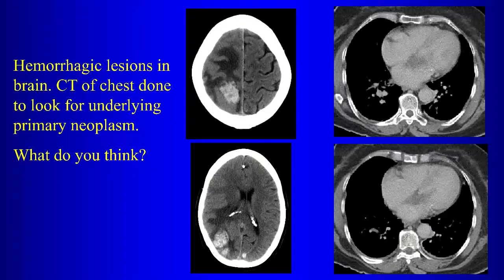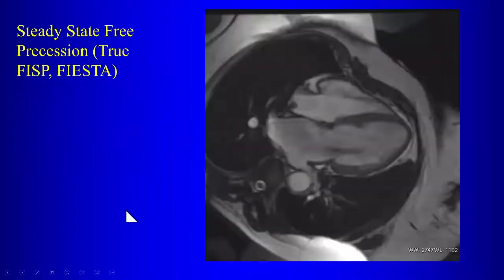Now, in your mind, imagine what that's going to show. What do you think it's going to show? In the left atrium, what is that filling defect going to be doing? Well, it's the bright blood image, it's not contrast. Yeah, it's going to be mobile, so it's going to be moving. Actually, you get a sense of it here, that it's going to be mobile as it extends across the mitral valve. So let's take a look at that.